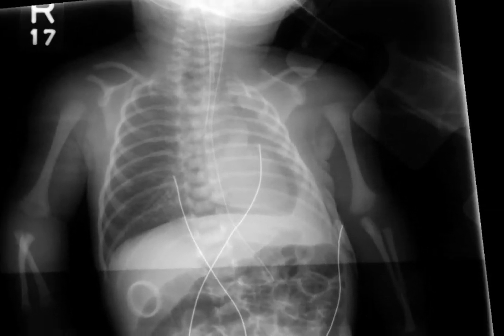The most serious consequences of interstitial air are the development of a pneumopericardium, which can lead to pericardial tamponade, as well as the most serious complication, which is air embolus because of massive intravascular air as a result of interstitial emphysema. Here you have a patient that obviously has a lucency that's outlining the heart, outlining the inferior aspect of the heart. And this is probably a pneumopericardium, but I'm only showing you this with the caveat that a pneumomediastinum can actually outline the inferior aspect of the heart on the frontal view.